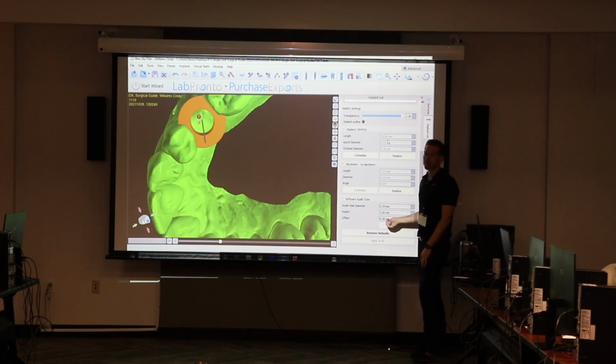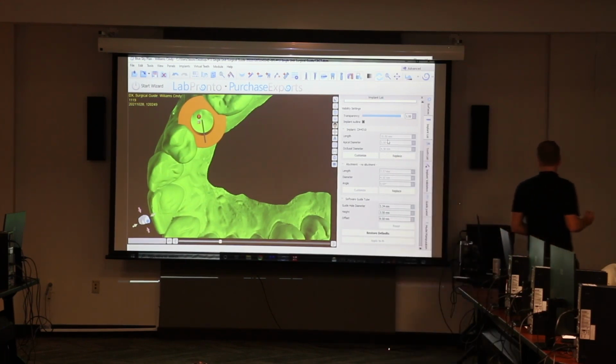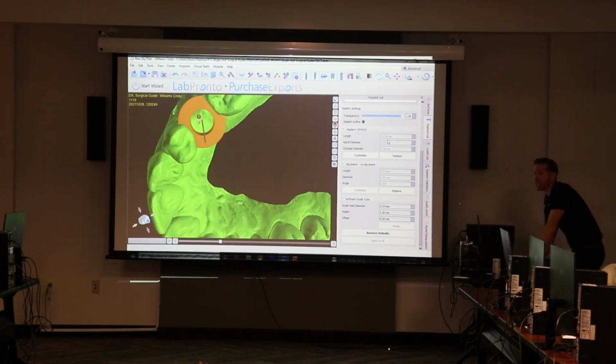And then offset. Here's our theory. So 8 millimeters is default because it's thinking we're putting a 0.5 millimeter sleeve with that lip in there to give us that 8.5 magic number. Let's all change it to go sleeveless because I think the majority of people would like to learn how to do it sleeveless.